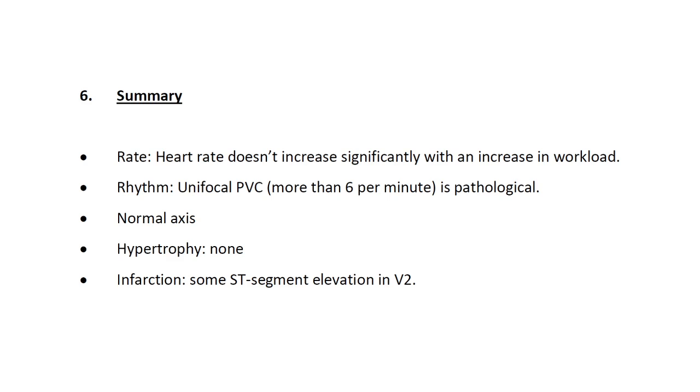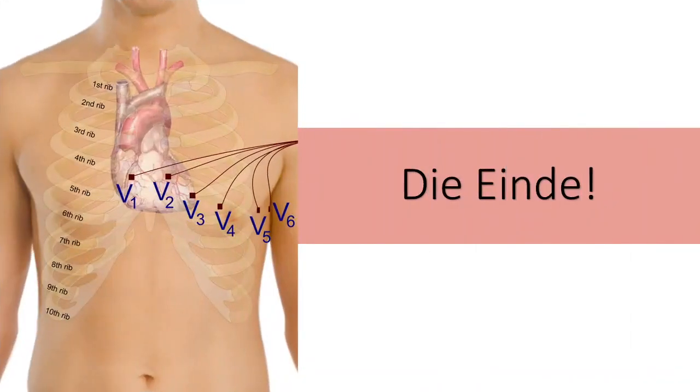Also give your conclusion. So what should happen now? I would refer this patient to the doctor to do more tests on this person before starting exercise. All right, thank you for listening.